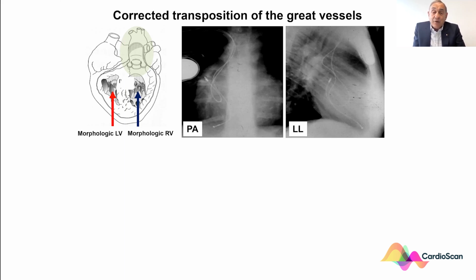People can spend hours trying to pass such leads across the tricuspid valve, but of course the tricuspid valve is lying straight up and down, and this is the easiest implant to do. On the left lateral, it is lying anterior in the chamber. What about the ECG?